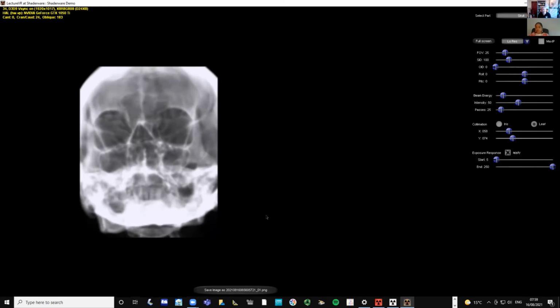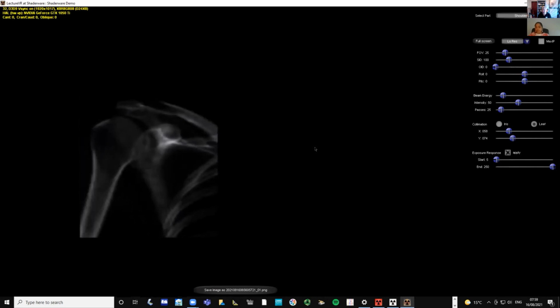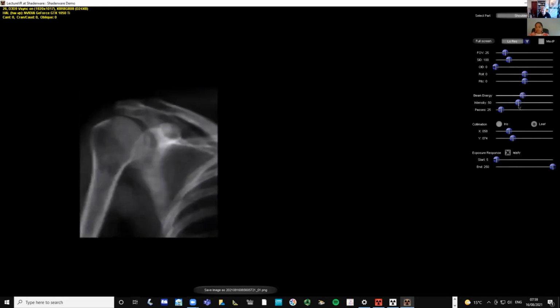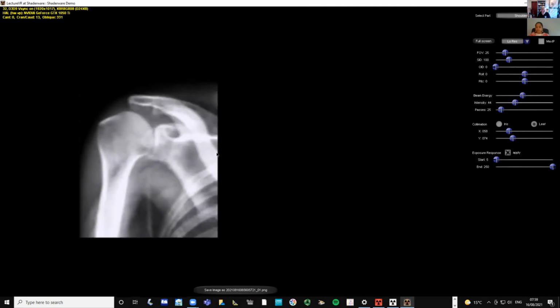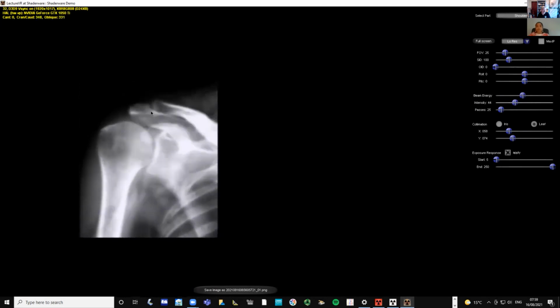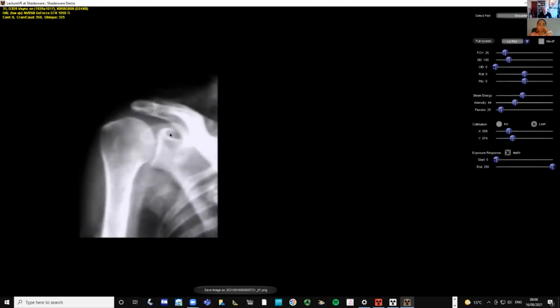Because it's not easy to find images that are poor technique, really. And so, as you can see, we can do every body part here with this, or a good range of body parts. You just use these sliders, so here we can look and see the acromion, we can see clavicle, coracoid process there. It all becomes clear what's what when you move it a little bit.